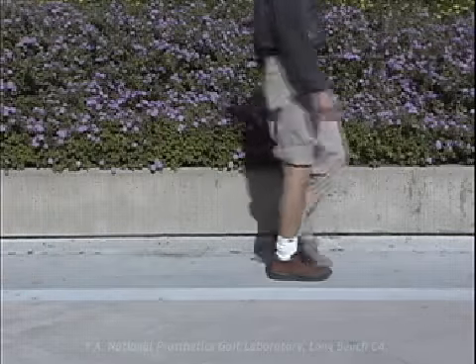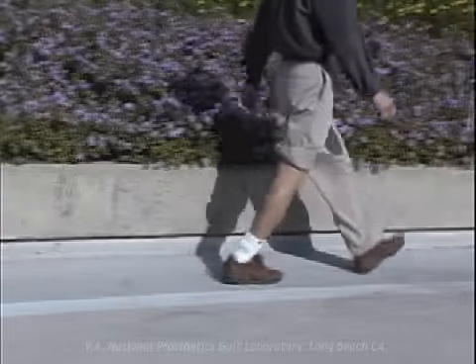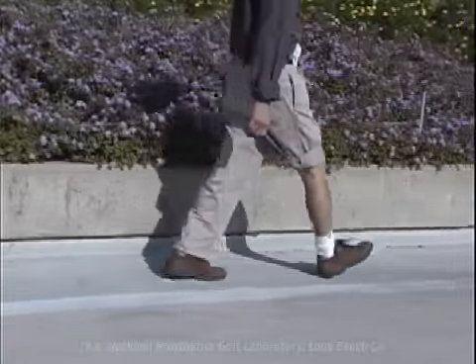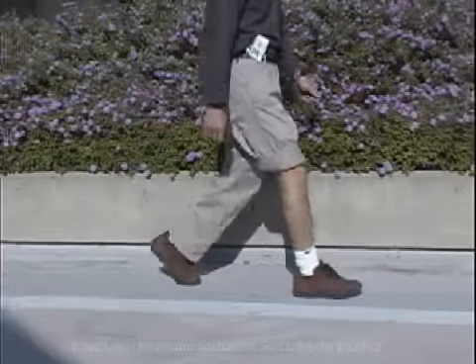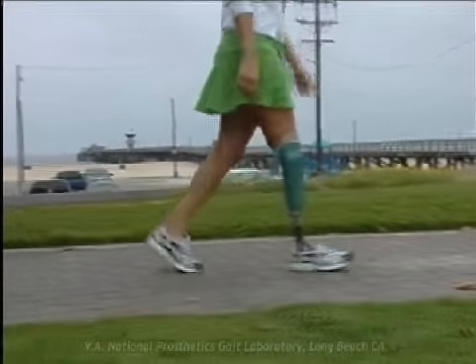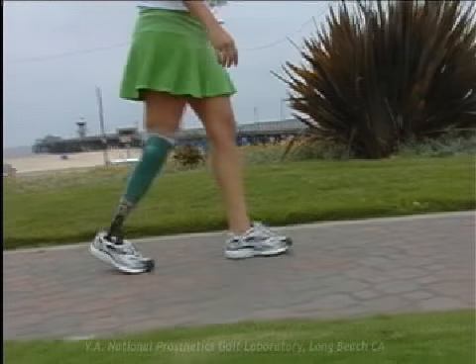In the gait of a non-amputee, the pretibials not only control rapid descent of the forefoot, they also advance the tibia relative to the forefoot, even as the foot moves into a plantar grade position. In this more forward placement, the tibia is better positioned to advance into mid-stance. This function is only partially replicated in prosthetic design.